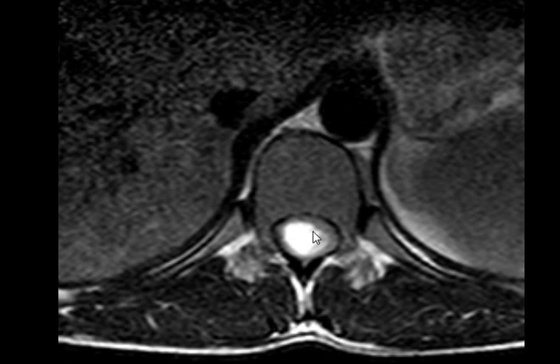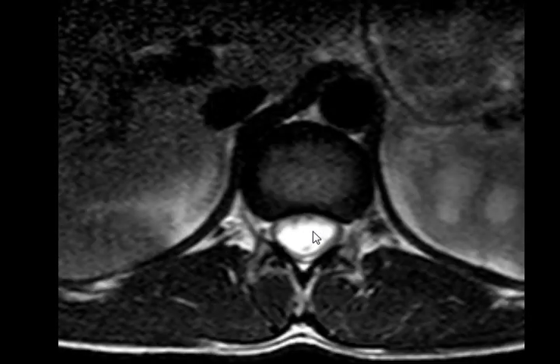Yes. Intradural, intramedullary, or intra. If it is intramedullary, definitely it's intradural. If it is intradural, it can be intramedullary or extramedullary. Okay? So it's intramedullary, intradural, with areas of T1 and T2 signal hyperintensities on non-saturated images and loss of signal intensity on saturated images.